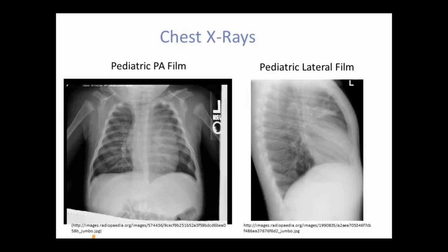This video is a series of cases that will take you step by step through how to interpret a pediatric chest X-ray. We will begin by understanding the components that make up an adequate quality film, and then move on to the actual interpretation of pediatric chest X-rays, moving through each organ system with a top-down approach.